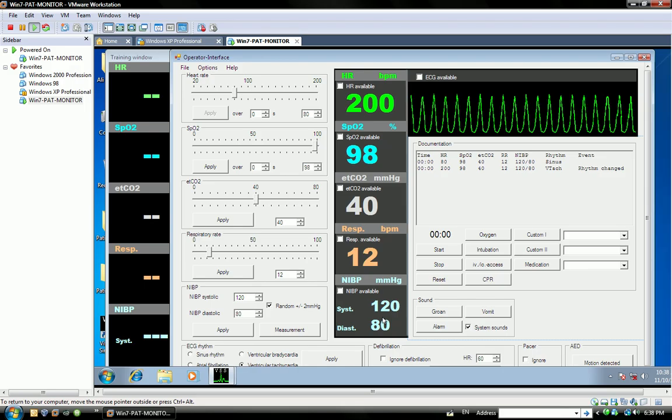If the patient was in fever, and the patient's forehead was in a deep frostbite, for example, if the month was December 2009 and the patient was experiencing... remember, this is an example, and this is an example event of when the patient will be in a critical condition. Please remember, this is an example date, okay?